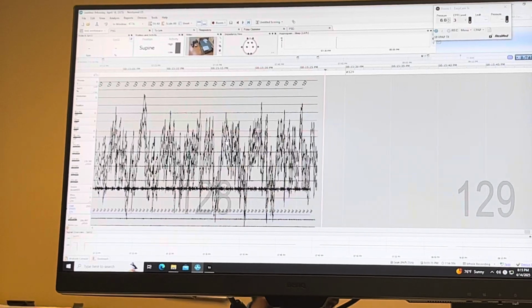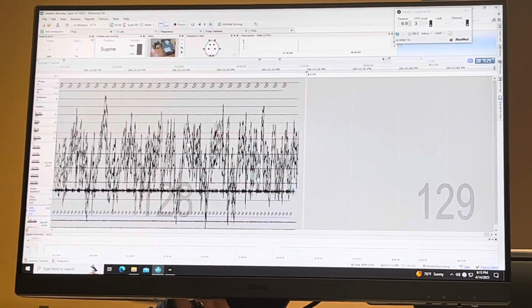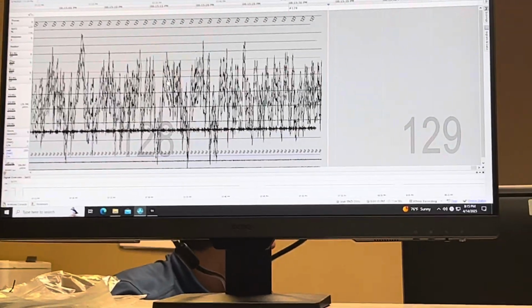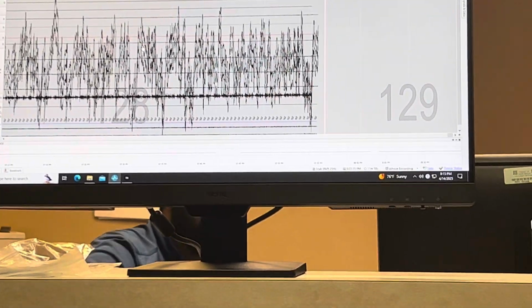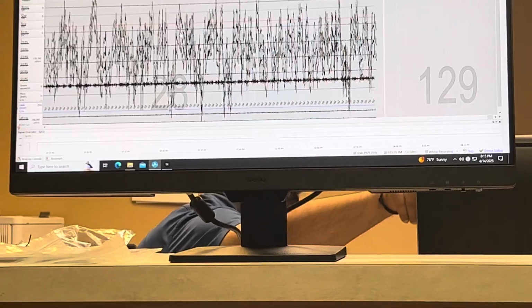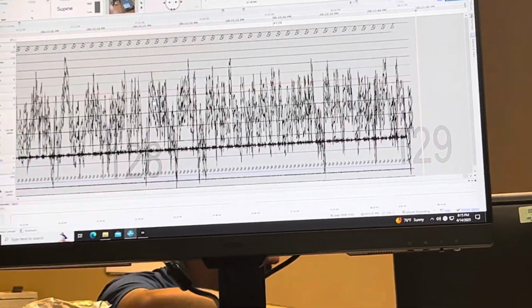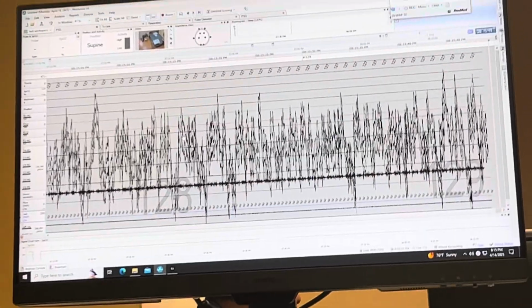Yeah, I like the ResMed because it gives you a true leak. I had to change that Omni to the unintentional leak because I'm like, why is this leak saying 53? Yeah, why is this leak saying 53? So I had to change it to unintentional, because the unintentional, right?